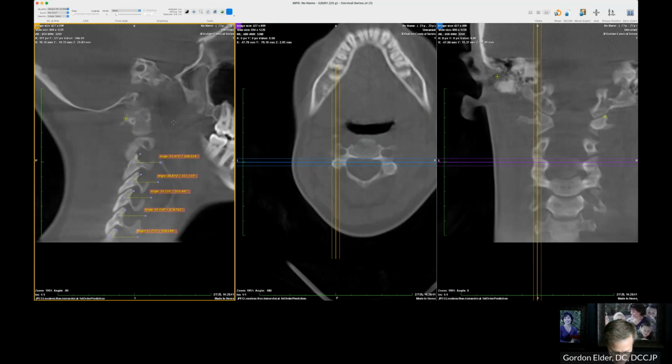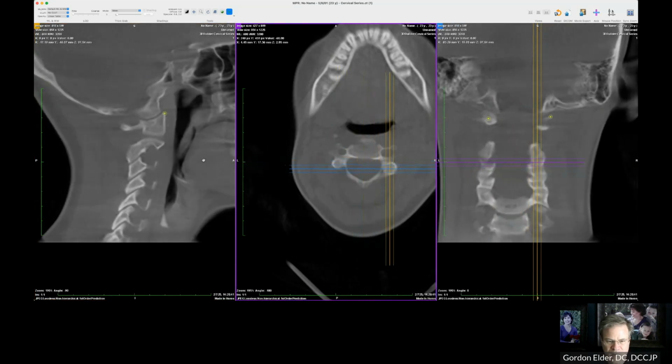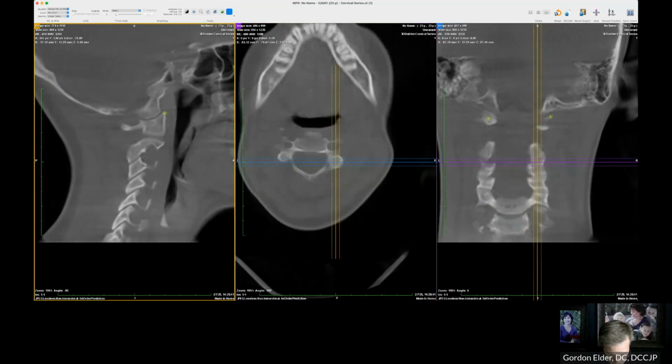So I've got that. I got those measurements. That's my left side. I'll write those down, take a screenshot. Now we're going to scramble over here before I analyze them, and we're going to do the same thing over here. And I still have that copied so that straight line at the bottom, my reference line, is still good. I'm going to copy the 1, 2, 3, 4 joints I need.